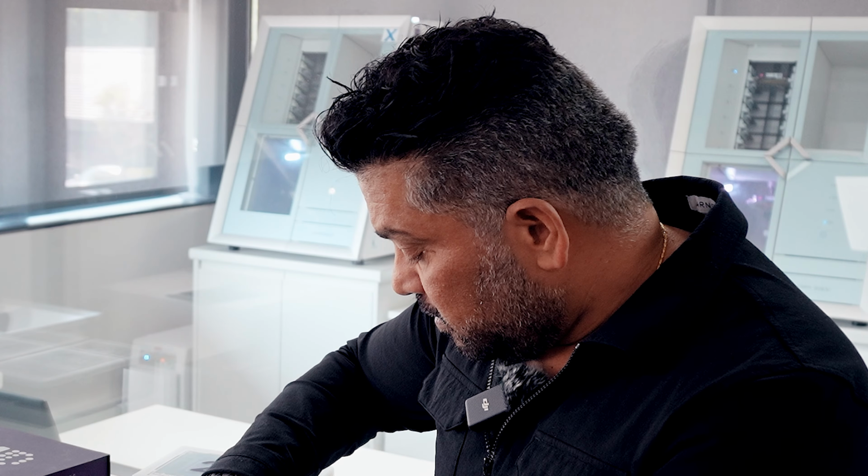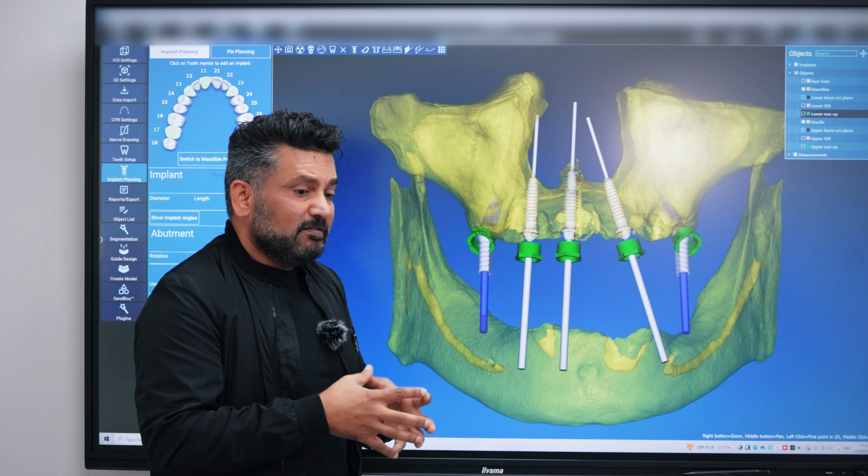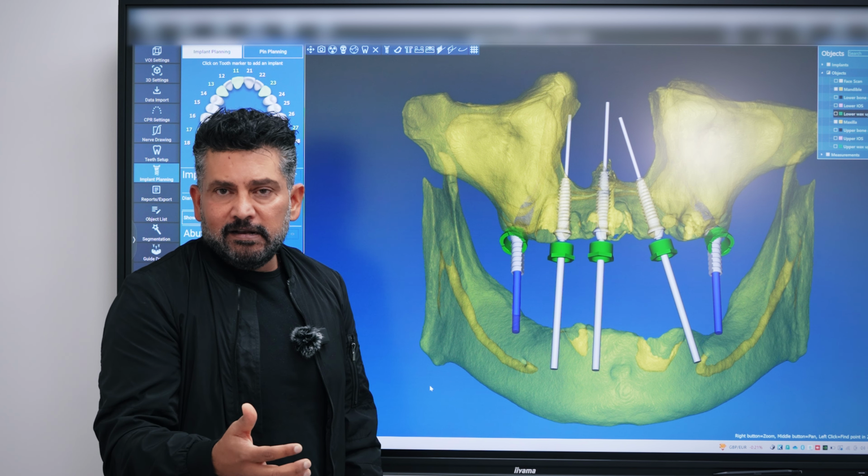So this, for example, is one of our surgical guides. It usually comes in 2 parts, and they're highly precise, and they're custom made for every single patient. Apart from the fact that it's a lot less traumatic for the patient, it's much faster than freehand, and it's very predictable in the positions.